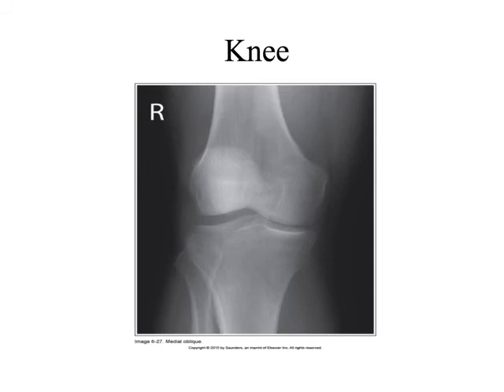That is a lateral. This is a lateral. Yeah, this is incorrect. This is lateral. Sorry. It says medial. For a medial oblique, we want to see that head of the fibula free of any superimposition with the tibia. Okay? So what I'm talking about is we want to see this guy out here further, to where it's free of superimposition out there. So this is a lateral oblique.